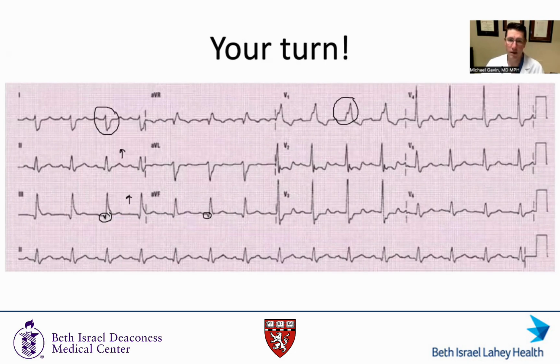So this could be right heart strain and right bundle branch block, things like RV cardiomyopathies or an acute insult to the right ventricle. It could be right bundle branch block and left posterior fascicular block. An echo ultimately will help you distinguish between those.